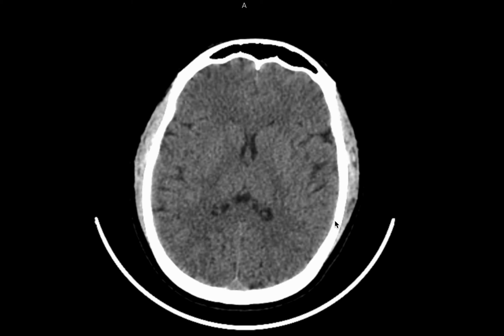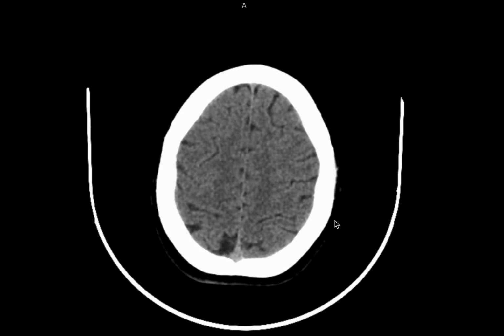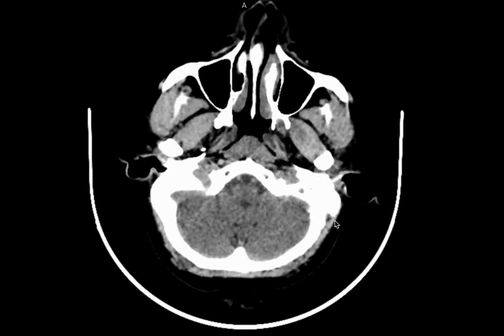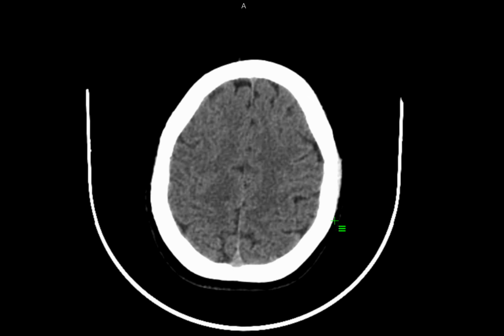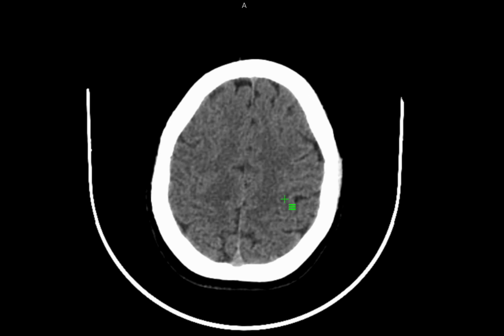Abin, and in this video I'll be explaining how I approach a CT head. So here first we look at the brain and we'll give a quick scroll from the top to the bottom just to see what we are dealing with. And then first we'll focus on the cerebral hemispheres.